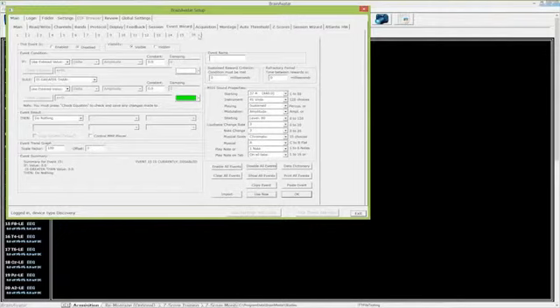So now when these third-party softwares look at the BrainMaster software and it's running and you have a protocol in emulation mode, it's going to basically go, I see delta. Okay, I see delta above the threshold. Okay, I'm going to go. So basically we have said to it, it's that threshold. And to go even further, all events that use the Event Wizard as the major driving mechanism are already done. So all Zscore protocols already have that done in there for you. It's already marked as emulation mode. You guys don't have to do anything.